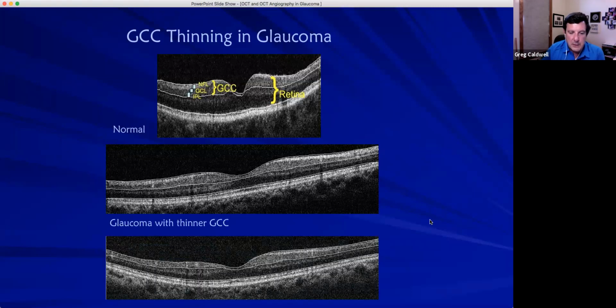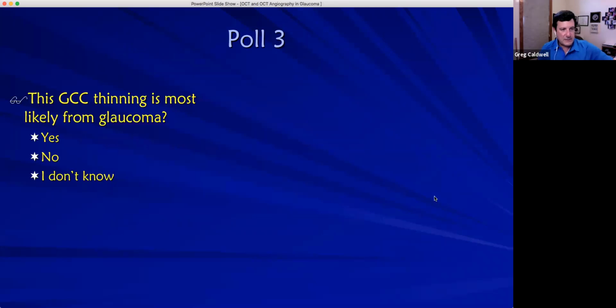And there's times whenever I do want to go in and just take a look at it. You don't always have to go by those numbers. And this is a patient with glaucoma. As you're looking, you can see that this looks pretty normal, but you can see here the nerve fiber layer is thinned on this side over here. You can see that this ganglion cell complex is atrophying away. And this is just a known glaucoma patient that I have, showing you that the segmentation lines, sometimes they can get pretty thick GCCs, or sometimes it just can't find it. You can go in and adjust it, move it up and down. But the segmentation of both of these examples is pretty good here. But this here is the example of glaucoma loss on this left side as compared to the right side here. So just learn how to dive into your OCT and take a look at those.